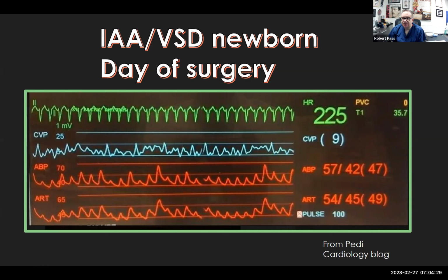Now, we can't tell from this whether the patient is in some kind of tachycardia like JET, or if this could be VT, right? You could have VT with ventriculoatrial dissociation or intermittent association. So you really would need a 12 lead in order to compare it to the baseline and know if the QRS morphology is the same or different.